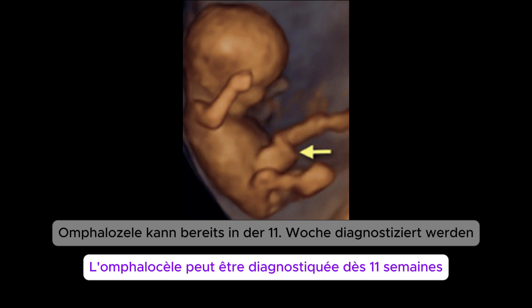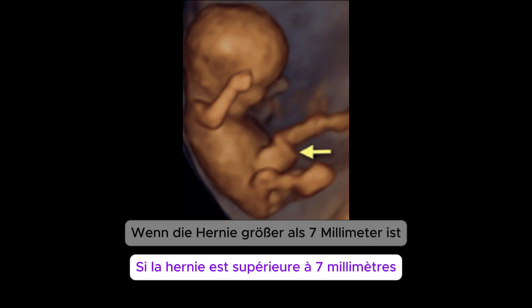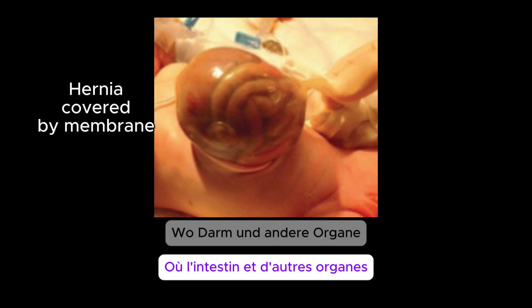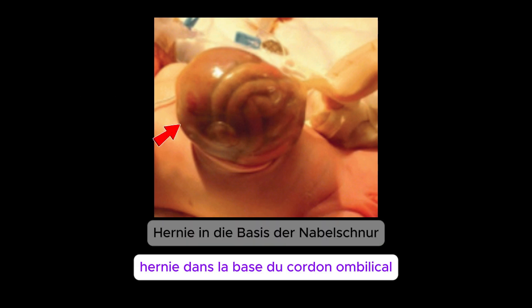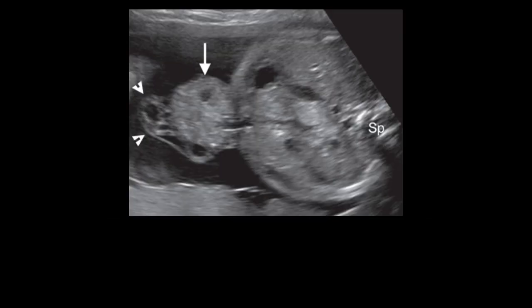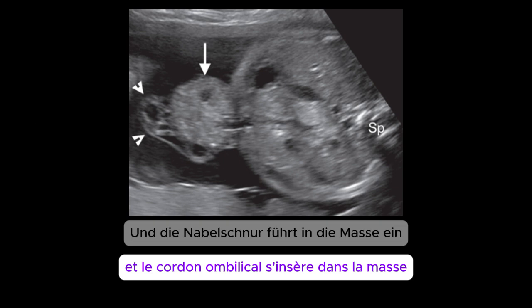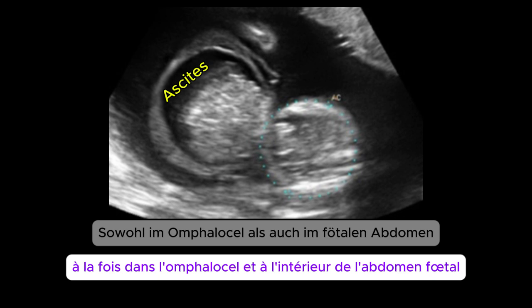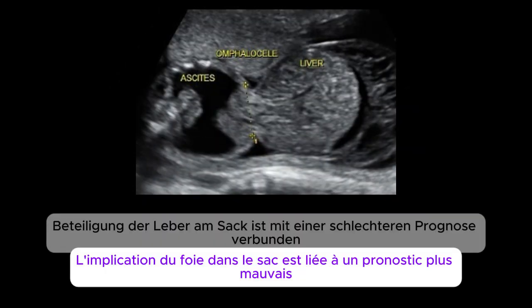Omphalocele can be diagnosed as early as 11 weeks if herniation is larger than 7 millimeters. It is an anterior abdominal wall defect where bowel and other organs herniate into the base of the umbilical cord. The herniated organs are covered by a thin membrane made up of amnion outer layer and peritoneum inner layer, and the umbilical cord inserts into the mass. Ascites may be present both in the omphalocele and inside the fetal abdomen. Involvement of the liver in the sac is linked to a poorer prognosis.